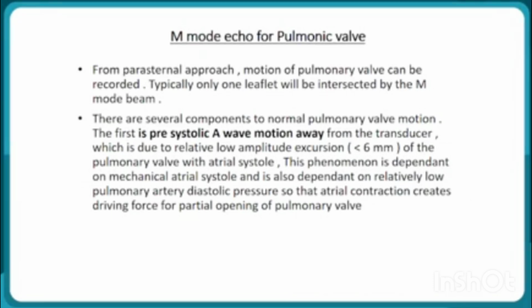This phenomenon depends on the following things. Firstly, the mechanical atrial systole, and it also depends on the relatively low pulmonary artery diastolic pressure, so that atrial contraction can create a driving force for the opening of the pulmonary valve, which we will see in the following images.